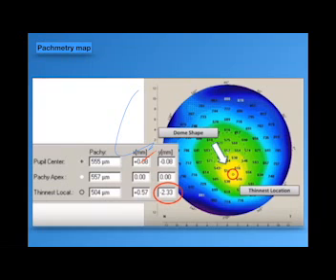Also, the horizontal deviation may be explained by scarring in the peripheral and mid-peripheral cornea. But the most important deviation is the vertical inferior deviation of more than -0.5. You will suspect more than -0.5 and don't do any surgery if more than -1. The third point is the difference of thickness between the corneal apex and the thinnest location. The difference between both shouldn't exceed 10 micrometer.